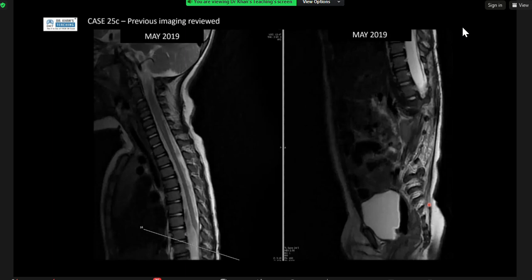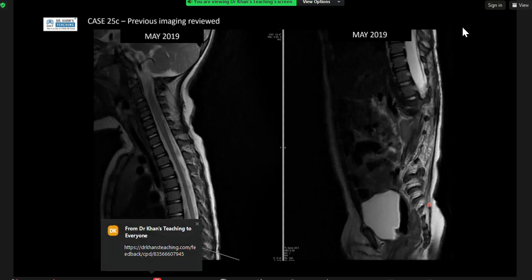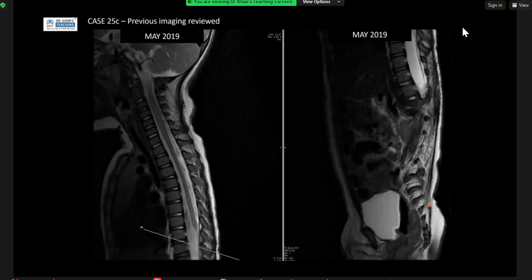I know I only give you a slice, but on the right hand side of the lumbar spine or lower spine, do you see that big lesion anymore? The patient had aggressive treatment. I can't remember what they give to treat neuroblastomas, but essentially they gave him the all clear. There is a residual small lesion seen in the mid-lumbar region, possibly what you're looking at.